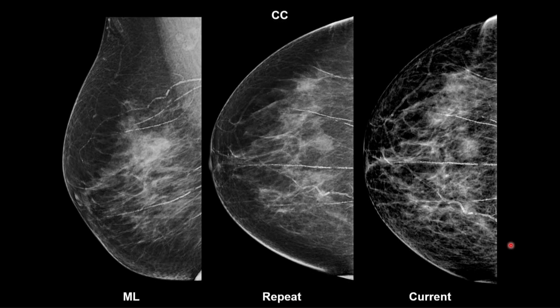And once you see it on two projections and you've got a rounded, convex outward finding that's denser in the center than at the periphery, you can call this a mass. It shifts from a workup of an asymmetry to a workup of a mass. And what do you want to know next? Well, if you've done TOMO, you get a really good look at its margin. If you haven't, you can. If you don't have TOMO, you can do spot mags, and that will give you another indication of its margin.